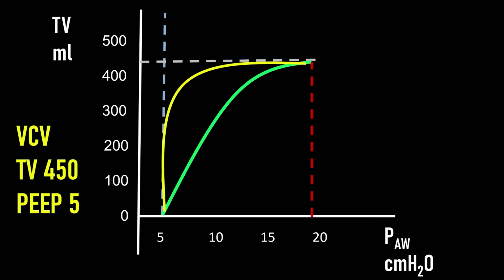The rate of change of volume with respect to pressure has altered. It's now taking much more pressure to generate the tidal volume that you require. What may be happening here is that the patient's lungs may be filling with fluid, or they may become consolidated, or the patient may be developing another problem such as intra-abdominal hypertension.